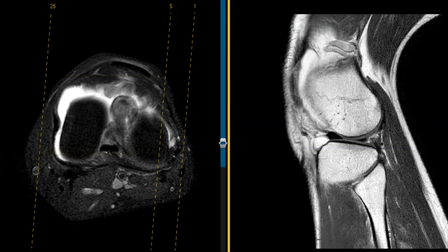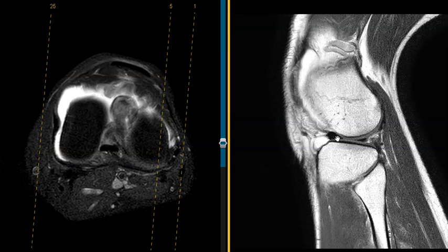This is a sagittal view. We see the front of the lateral meniscus, a little black triangle fitting between the femur and the flat tibial shelf here. We see the anterior horn of this lateral meniscus, and the posterior horn should look like a mirror image, but instead it's half the size or smaller, and there's a vertical band of brightness here. That's a longitudinal tear right within the posterior horn.